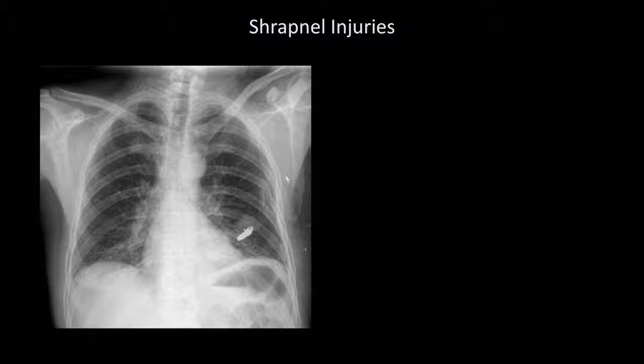Depending upon where you practice medicine, another soft tissue abnormality that may be seen from time to time is shrapnel injury. Here's an X-ray of an acutely wounded soldier. We can see that there are a number of small metallic objects that have penetrated his body on the left side. This one here is clearly extrathoracic. However, what about the largest one? Where exactly is this fragment?